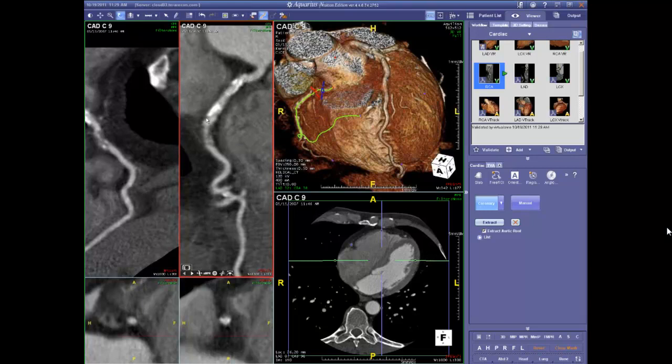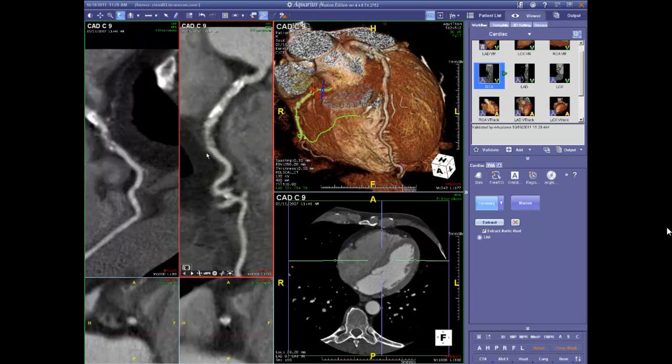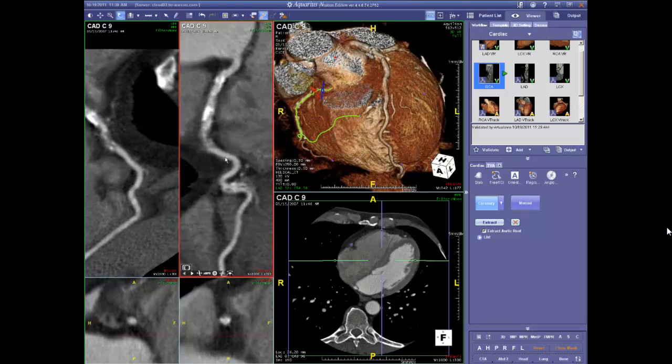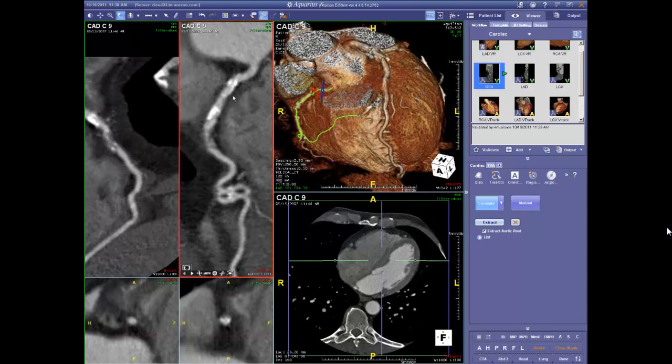Things look a little fuzzier than they did in the previous study, and that's probably not a matter of the artery surfaces themselves being any different. There's certainly a great deal more plaque, but I think this fuzziness is more of an issue of technique and perhaps the settings that were used to generate these images. There may have been a little less energy put in. But I think the most worrisome area here is not necessarily where we see all this calcium, because I can be convinced that there's contrast material in here. But I think this spot over here looks very disturbing.